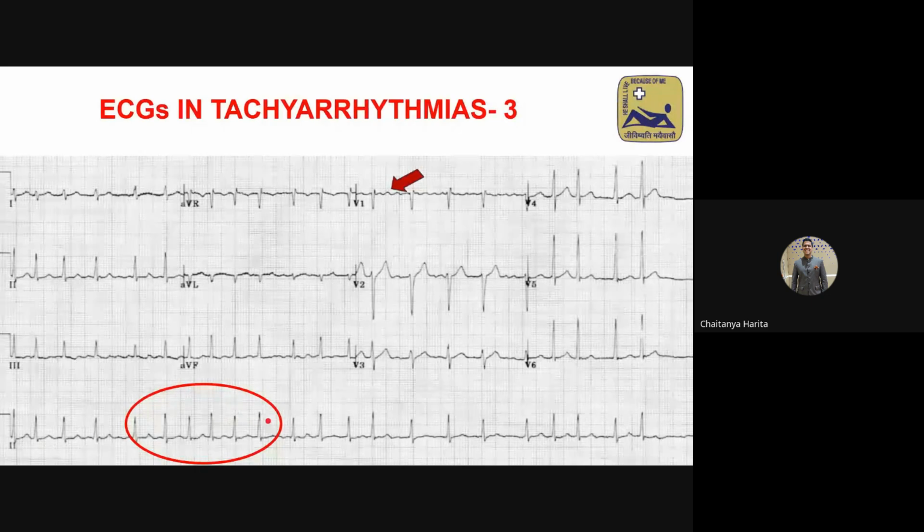Here it's 1 and 3/4. Here it's more than 2. So you will see that from every R wave to the next, there is a change in the amount of interval. If you look at the bottommost, here there's a 3 squares gap. Here there's only 2 squares, again 3 squares. Also, not every QRS complex has a P wave before it, right?